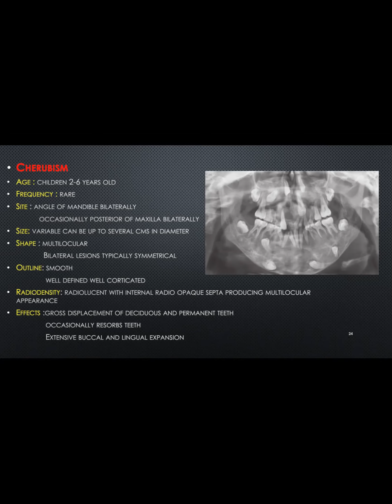Now, as you can see, it causes gross displacement of deciduous and permanent teeth. You can see that the teeth are all over the place, and it occasionally resorbs teeth. It could also cause extensive buccal and lingual expansion.